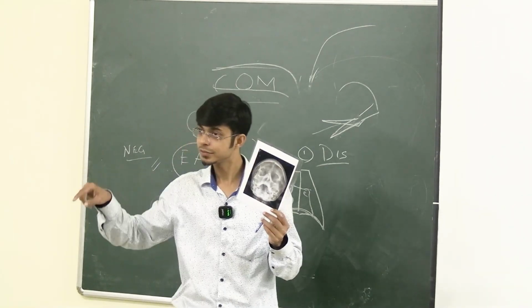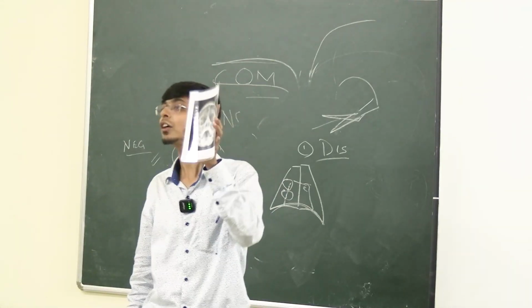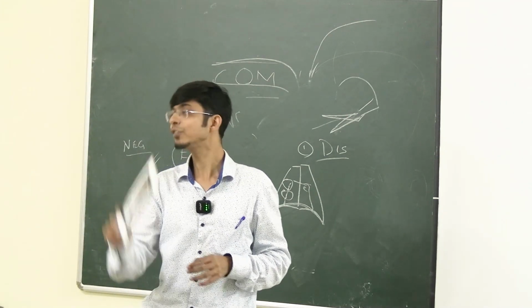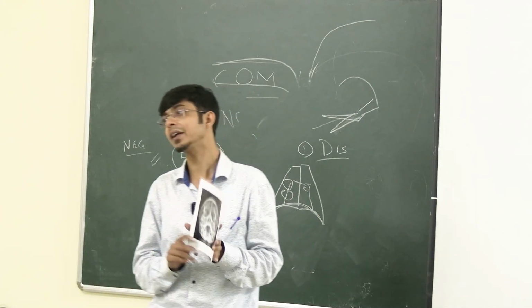OM view, it is called. Okay? So why do we do an OM view? What do we do it for, what do we look at? Mainly for paranasal sinuses. Mainly for evaluation of the paranasal sinuses.